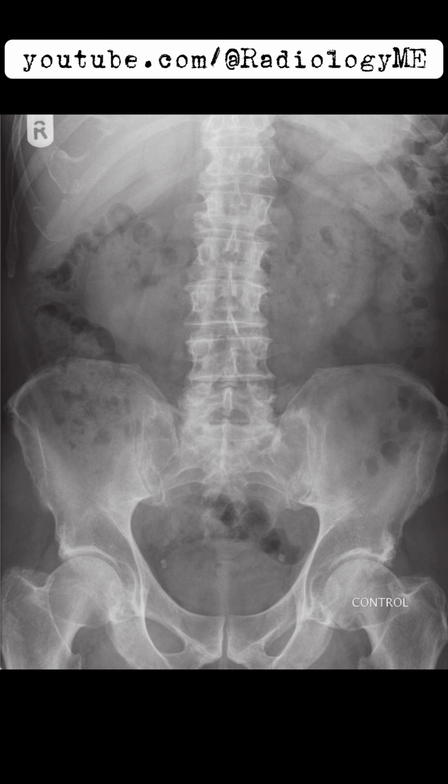At this point, I would routinely examine the rest of the imaging, possibly with contrast studies or a follow-up CT to assess any filling defects or renal obstruction. Calculi can cause all sorts of trouble, especially in anatomically abnormal kidneys like this, so follow-up is definitely warranted.